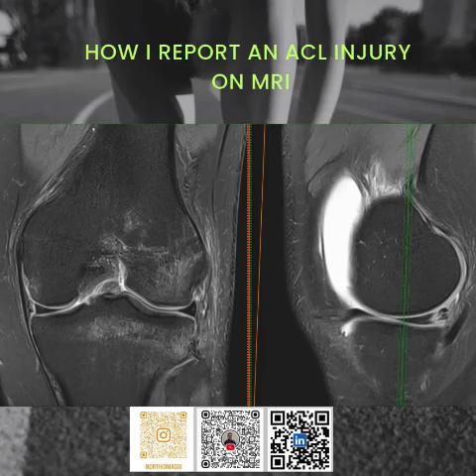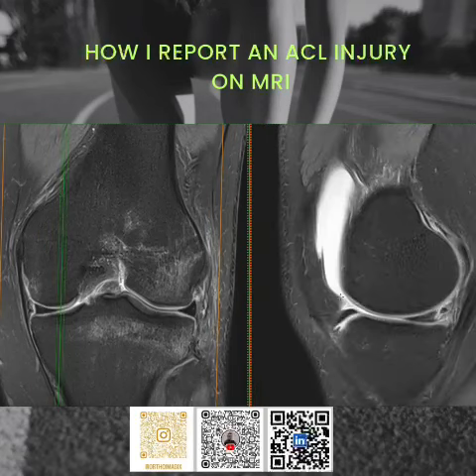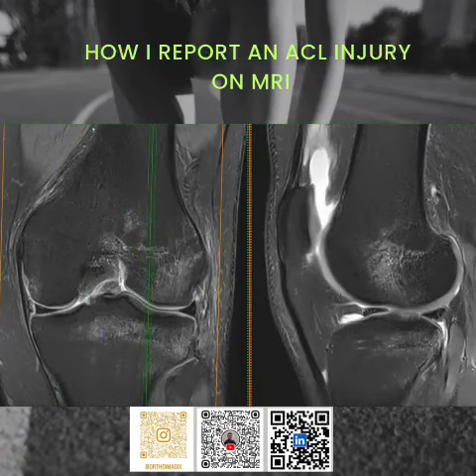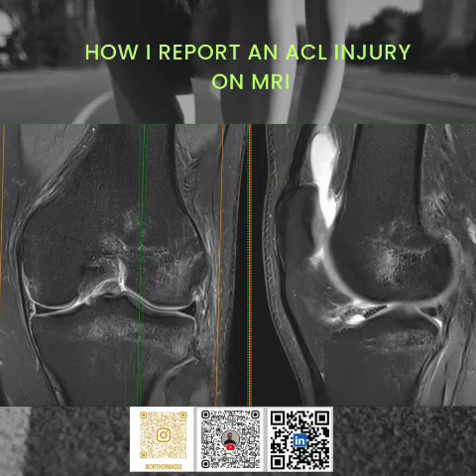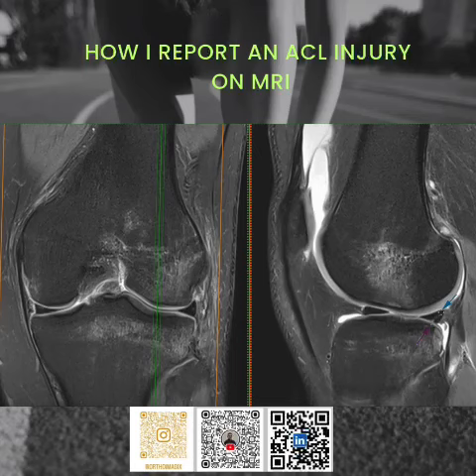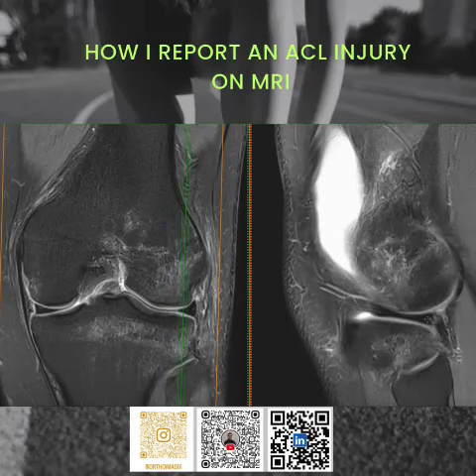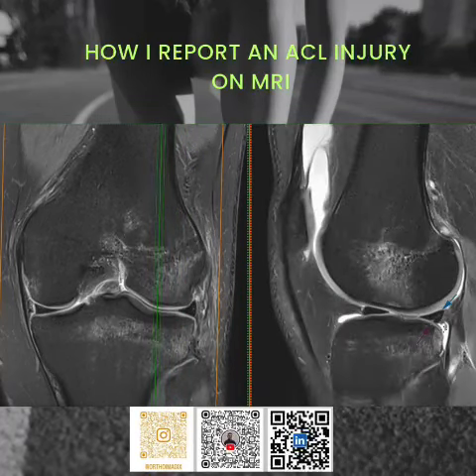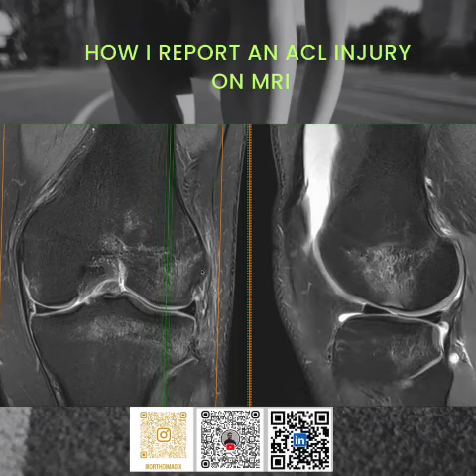On the lateral aspect, when we look at the anterior horn, the body and the posterior horn of the lateral meniscus, it looks more or less fine, but when we look very carefully, we should look at the site of Wrisberg ligament attachment. So this is the Wrisberg ligament, and where it is attaching to the posterior horn of the lateral meniscus, we can see an oblique longitudinal tear at the meniscocapsular junction, in the peripheral third, but this is not extending to the body segment. So we will just say that this is a peripheral longitudinal tear in the red zone. Apart from that, the articular cartilage looks absolutely fine.